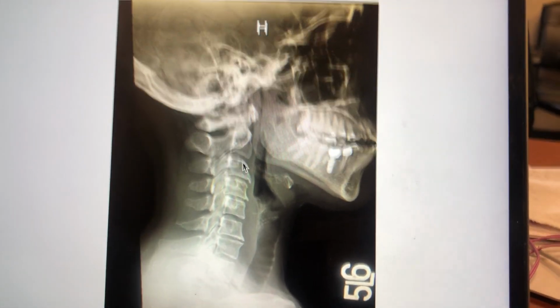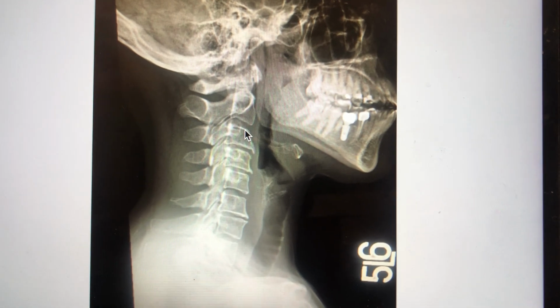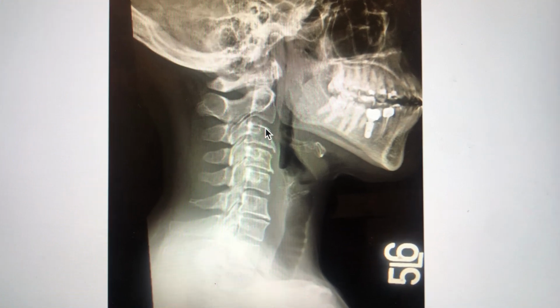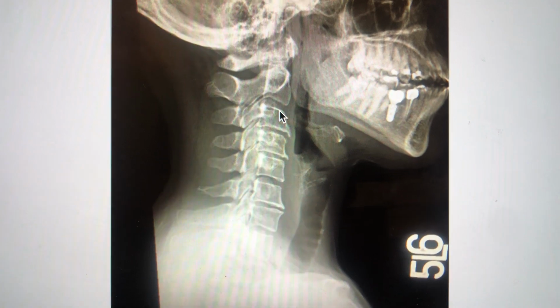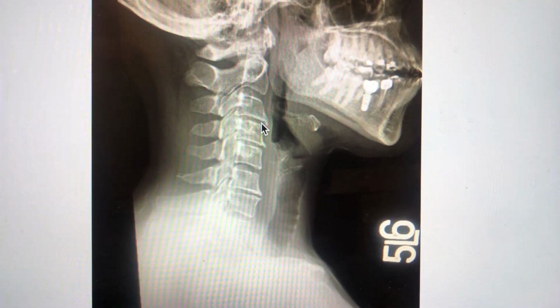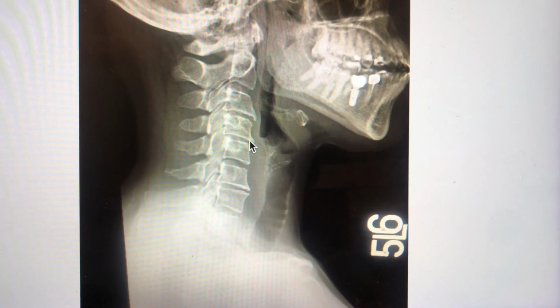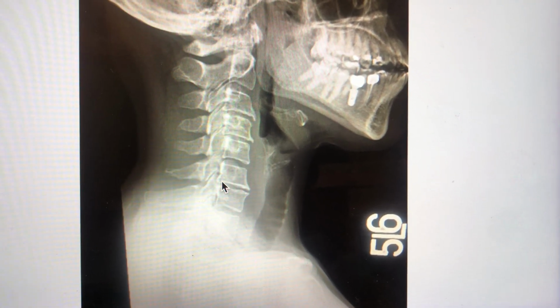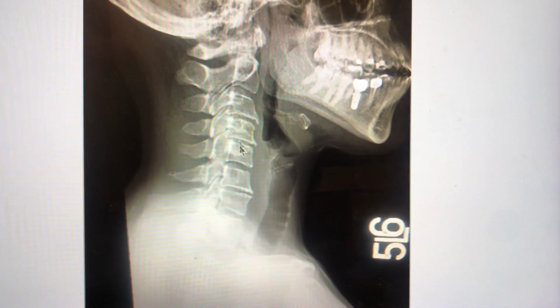The neck is highly mobile, and as a result, there are a lot of physical demands on it. And as a result of that, we think it doesn't recover perfectly from every day's wear and tear. And over time, you accrue degenerative changes that can be appreciated on this imaging as I enumerated, with loss of disc height, bony spurs, sclerosis of the bones here, sometimes straightening of the neck perhaps, sometimes instability where one bone will slide forward on another. That's of greater concern than some of these other changes.